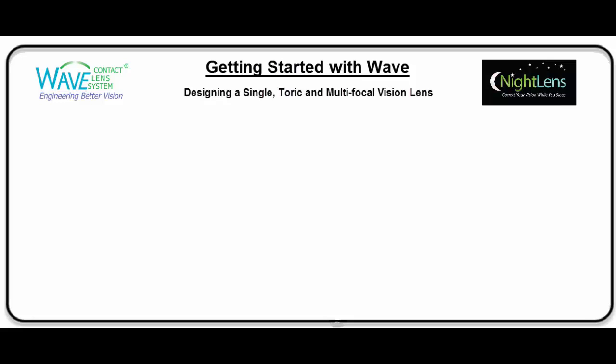This training video is the first video you should watch in the Getting Started with Wave video series. It's very important, however, that you familiarize yourself first with the Wave screen interface walkthrough before viewing the video. If you've not taken that step, I highly recommend that you take a few minutes right now to do that. The ideas that I present in this video will build on the information that's been presented there.